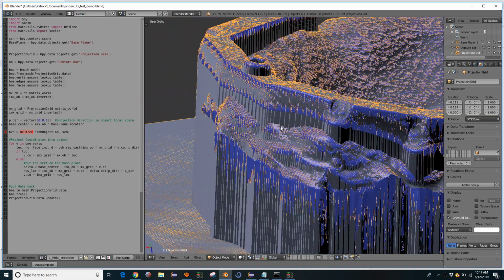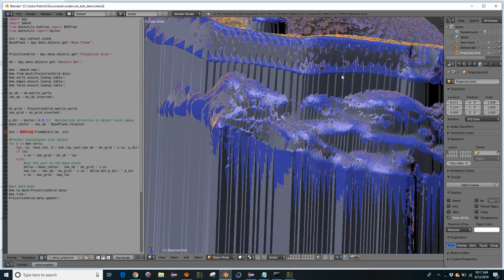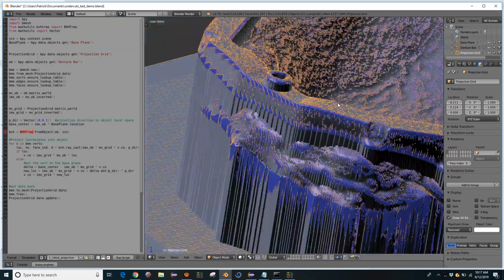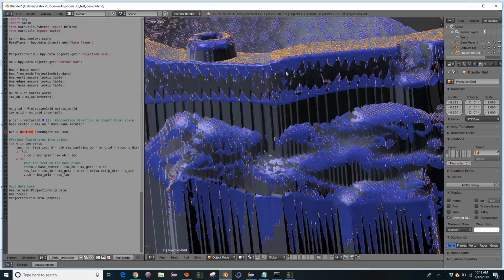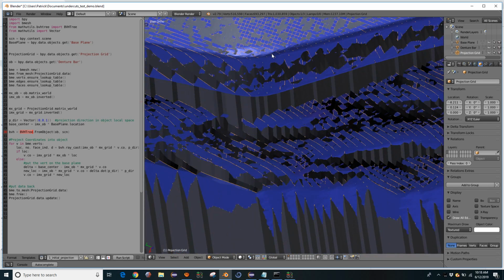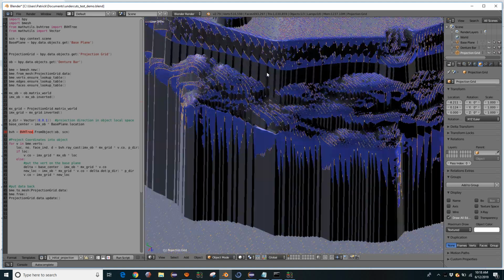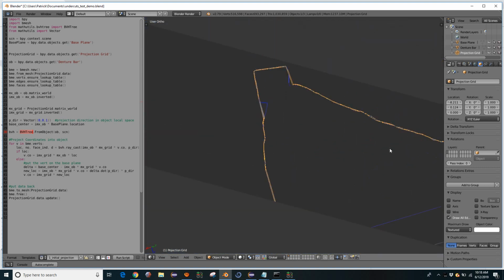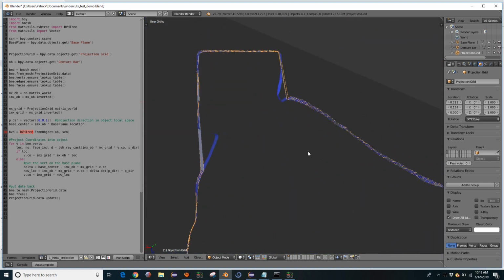But what we can see is that we still have quite a bit of error, just eyeballing it here. We could quantify this. If you knew the maximum height of a particular drop-off or undercut, and you estimated the worst case scenario spacing where you miss the corner by the width of the grid, you could actually quantify the error here, and then you could work backwards to find out the resolution you would need to make that error acceptable.